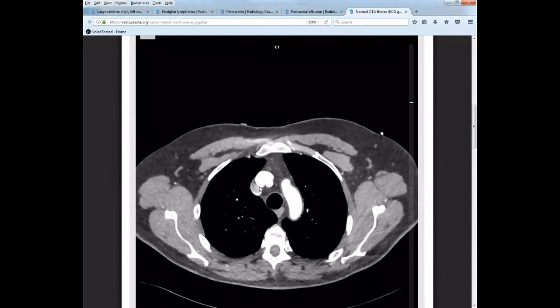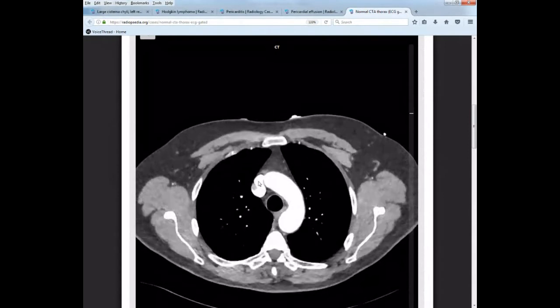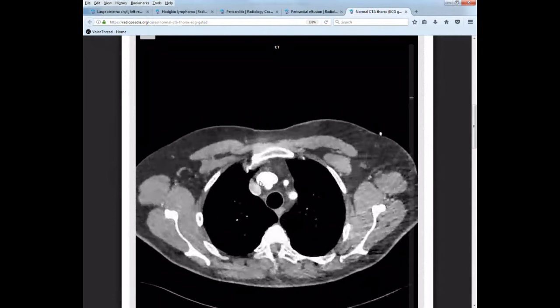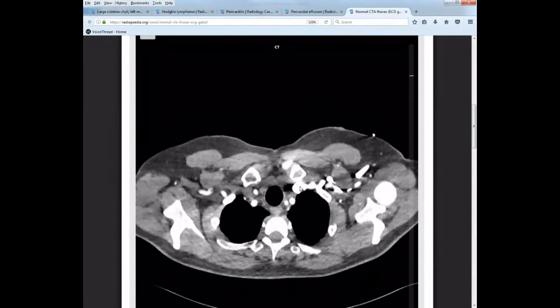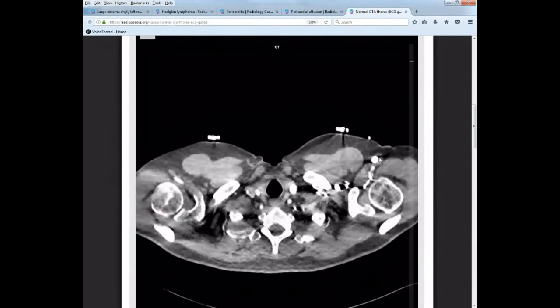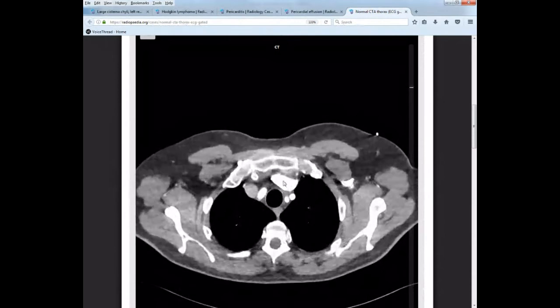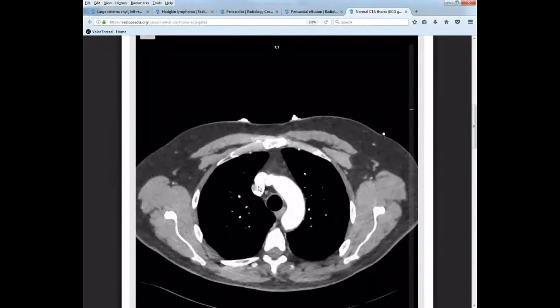Venous flow, harder to see because we don't have a venous study. You do have to know the branches. It's just going to be difficult for you to see. I would have you recognize the left brachiocephalic, especially on this study if it shows up on a test, because the left subclavian is where the contrast is, coming over into left brachiocephalic, dumping into superior vena cava.